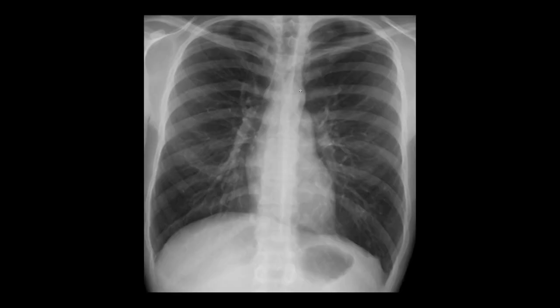Moving on to the last X-ray, again you can pause the video here, and in this case we again have a small apical pneumothorax. The left side, you can just about trace it over there. I think I went off slightly over there, but you can rewind and have a look. So that's again the layer of the visceral pleura, and you can imagine having the parietal pleura on the outside. Giving the yellow shaded region as your apical pneumothorax.